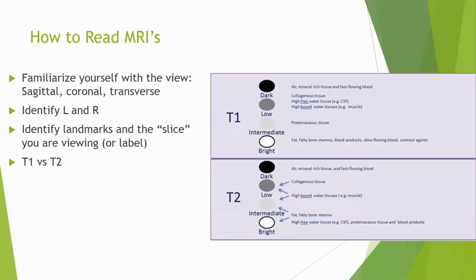Just remember, when you look at the scan like this, the patient is in this direction and the scans are circular. So they make this kind of cuts. When you look at the slice, you are looking at the patient from inferior to superior, from the foot end to the head end.